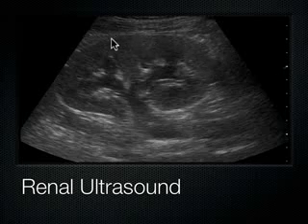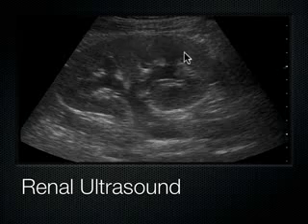And so when somebody has a blockage of the kidney, like a kidney stone, there's really nowhere for the kidney to go to expand, and so that's why people get excruciating colicky pain with kidney stones. It's because of this capsule, this thick structure out here. Coming in from the capsule, we have the cortex. This material back here, this very isoechoic material here, is the cortex of the kidney.